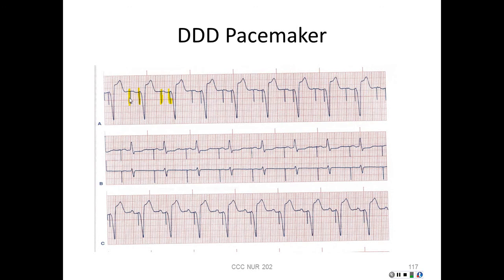The pacemaker is firing to stimulate the atrium to get that atrial kick, and then it's firing to initiate the ventricles, doing it both here. Here on this one, we have the atrial pacemaker firing. We get a P wave, and then we just get a normal QRS-looking complex. It sensed that the QRS fired, so it doesn't need to pace for the ventricles.